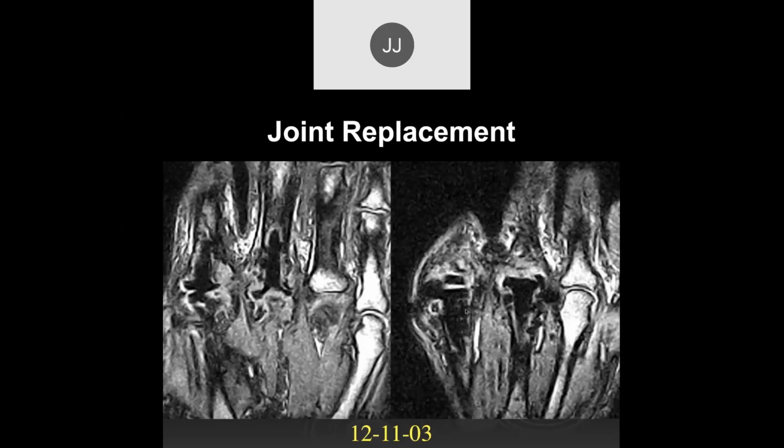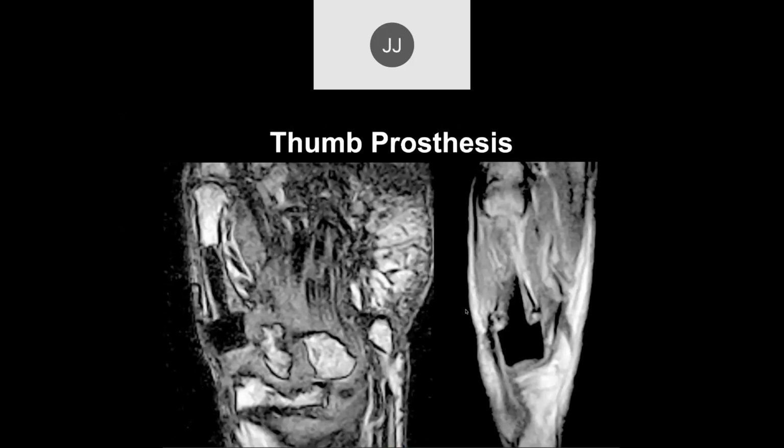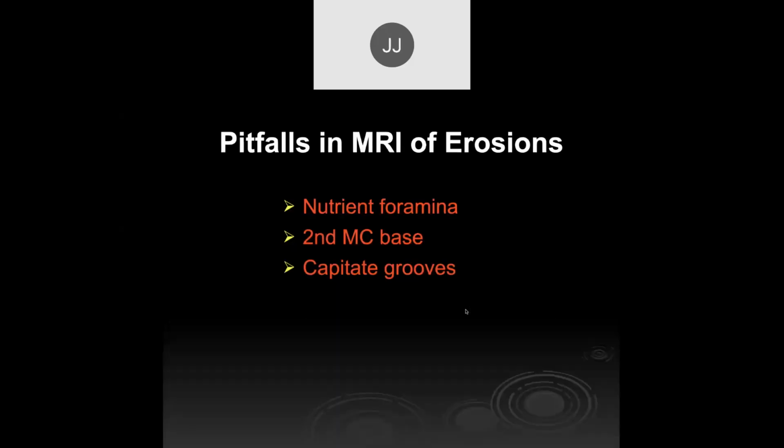These are silicone implants, which we used in the 70s. They worked about a year or so, and then they broke and produced particles that had to be removed. Yeah. But they did not work. Silicone does not do the job. Yeah, and here's one in the base of the thumb.